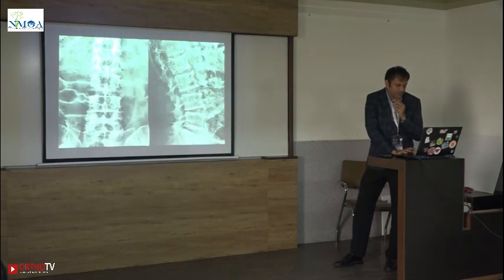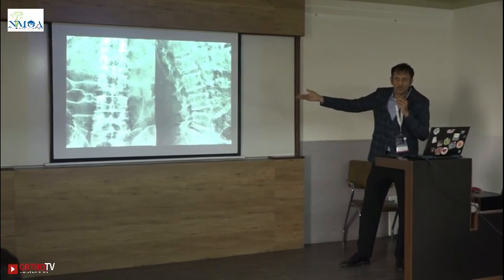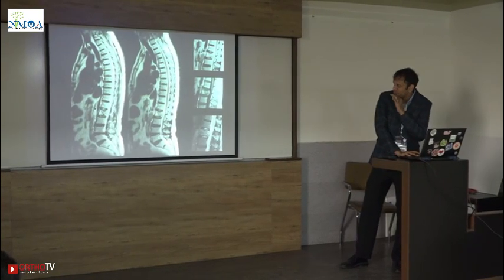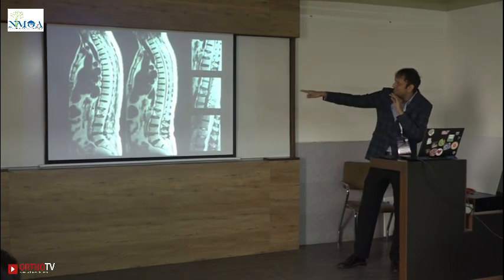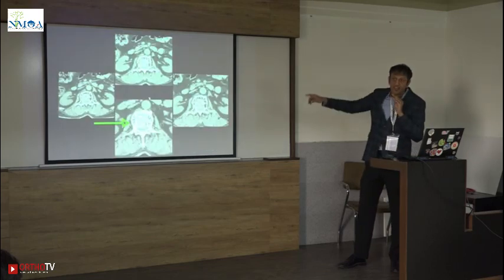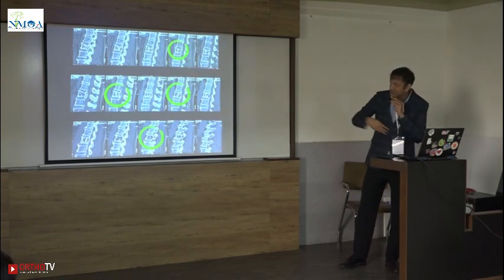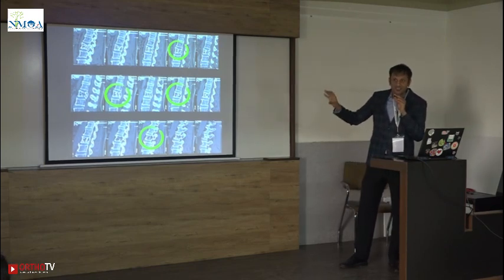Going further, this is again one of those X-rays which Manish also showed. There's something going on in the L2. The MR also had a few telltale signs of it going towards a hemangioma, though it is not exactly showing that it's a hemangioma. But this is something very rare: it had honeycombing on the CT scan, which is a telltale sign of a hemangioma. More importantly, what is even rarer is that there's a pathological fracture within a hemangioma, which you don't often see.